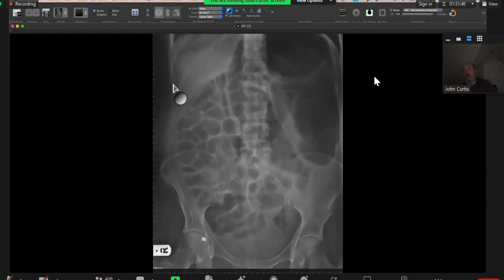Good. Okay, another patient with abdo pain. Yeah. So this is the radiograph abdomen of a skeletally mature patient showing a large air-filled hollow viscus, predominantly in the left abdominal quadrant, and displacing the small bowel loops on the right side.